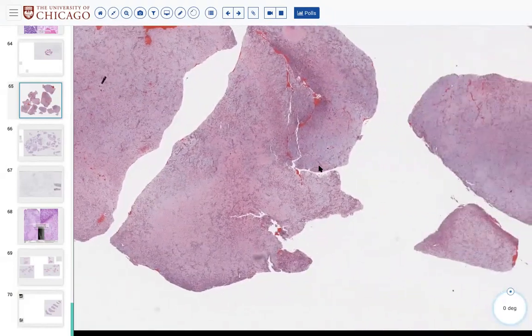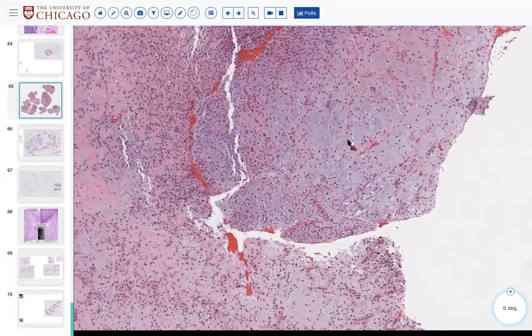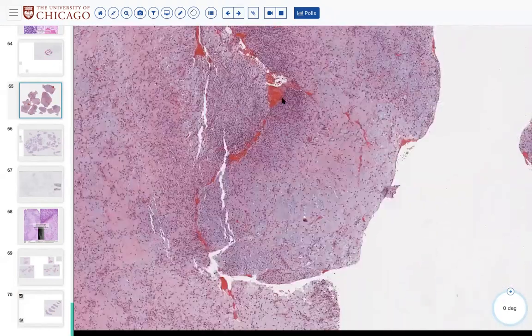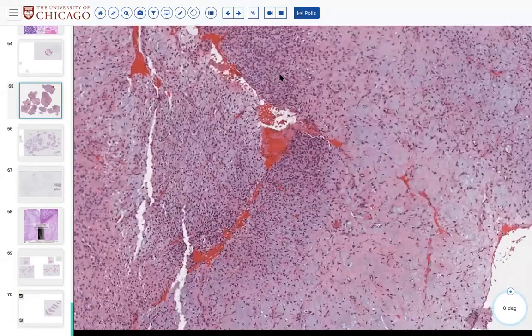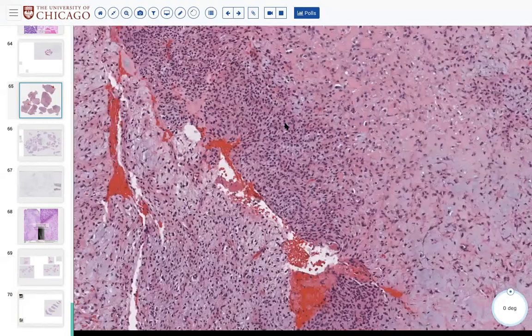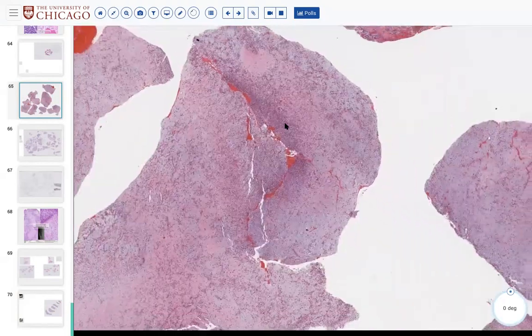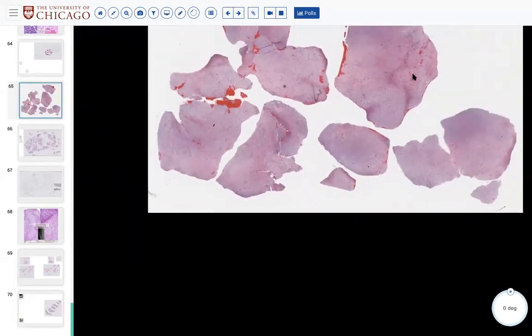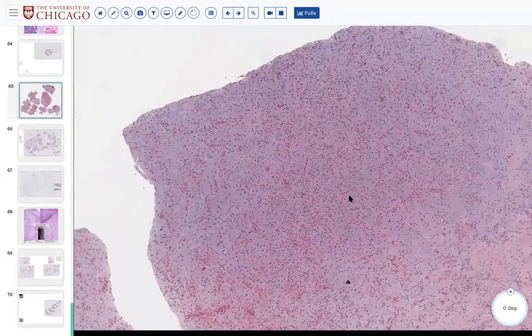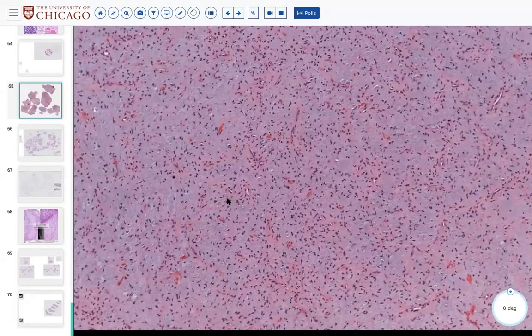Cool. All right. So you've had a chance now to look around at what I've been showing you. Does anybody have any thoughts in this young patient with a lesion of the long bones? I don't even need to show you the radiology because the histology is so characteristic. Reham says cartilage forming tumor.